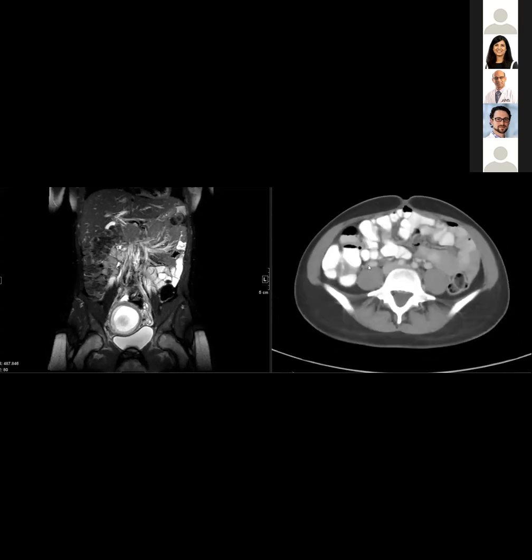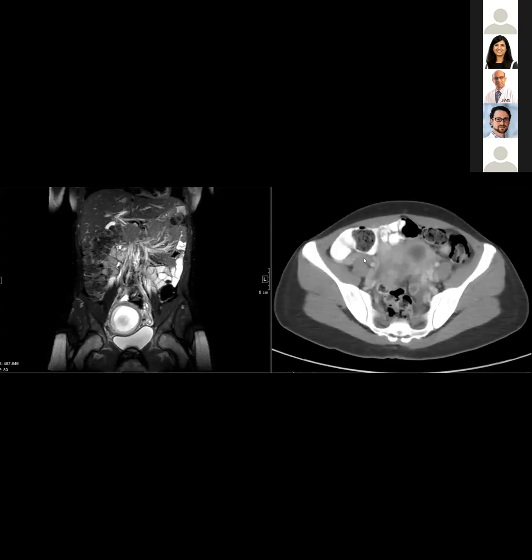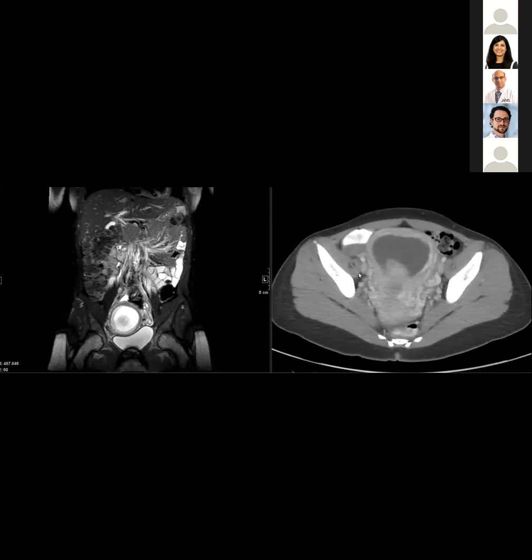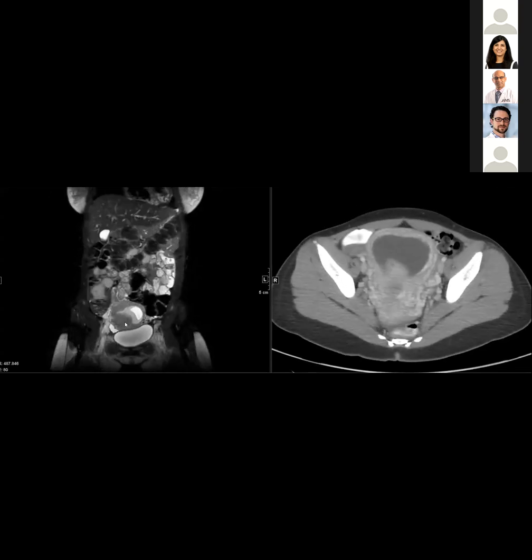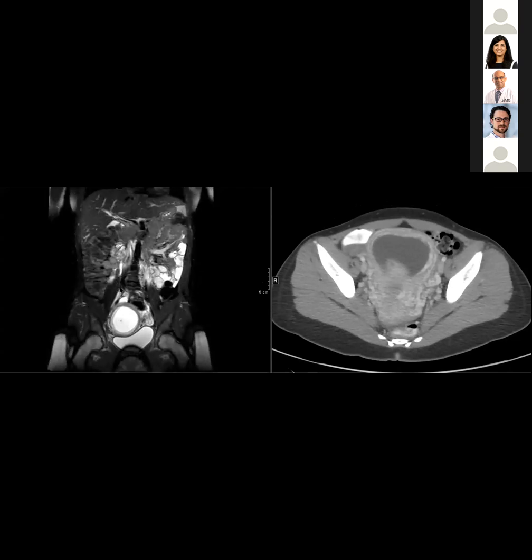There's really no twisting. I was really looking for twisting. The ovary, here's the left ovary. Yeah, that one looks good. So I suspect she had some sort of torsion situation happening. Yeah, I do too, but I'm dubious about the gonadal vein stuff, though.